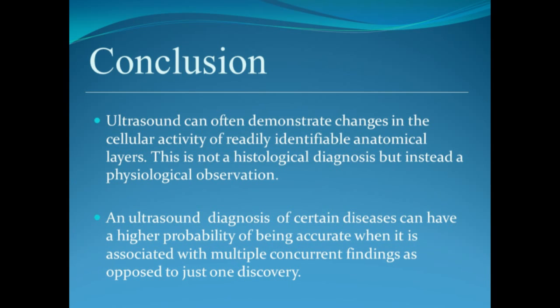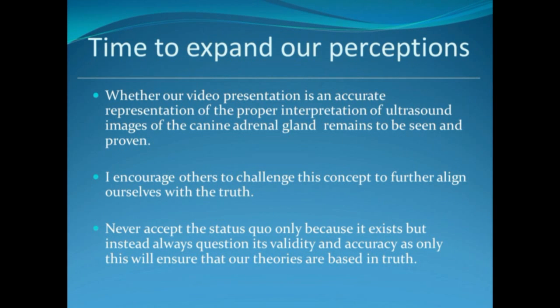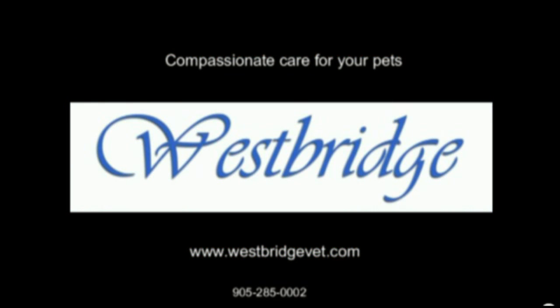I hope that this presentation changes a little bit how you may look at organs. Although being controversial, I hope that it's open to questioning and verification if in fact this interpretation of a reading of an adrenal gland is in fact correct. So the idea of the presentation is to create a new way of thinking and looking at adrenal glands and bring ultrasonography to a new level of confidence in your ability to interpret what is actually going on with the pet. So keep an open mind, think out loud, expand your horizons, and let's go seek the truth.